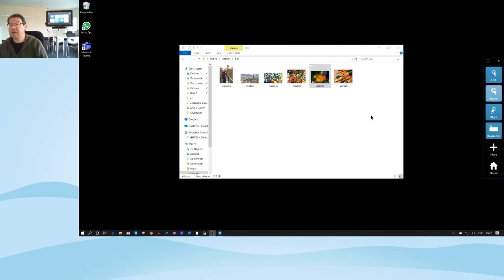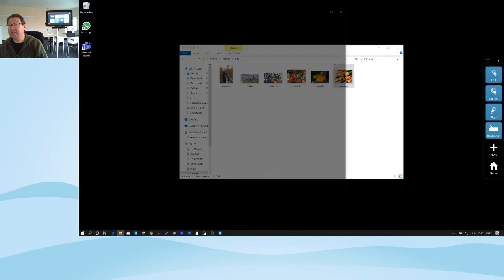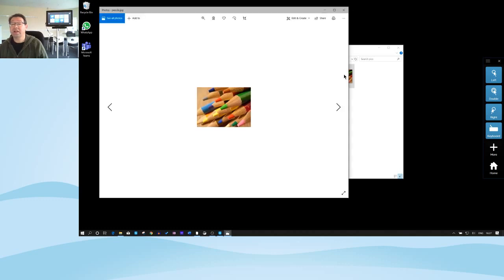And then I'll move the cursor, and then I'll stop moving. And then as it zooms in, I'm going to steer, and it's going to double click on where the mouse pointer is hovering. So that's the default setup, is that it will zoom in and then click. You can change it in settings to dwell to click if you prefer that.